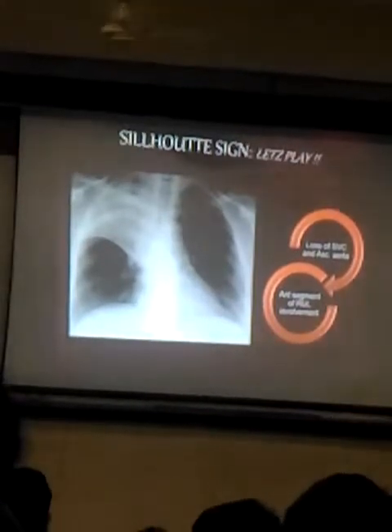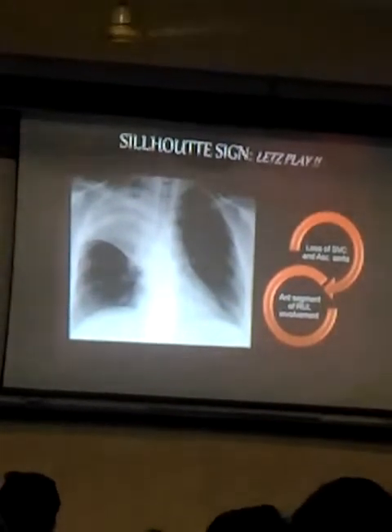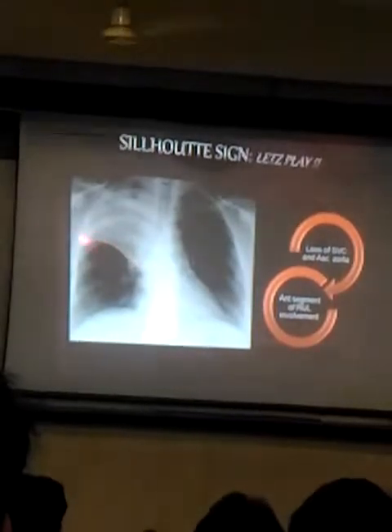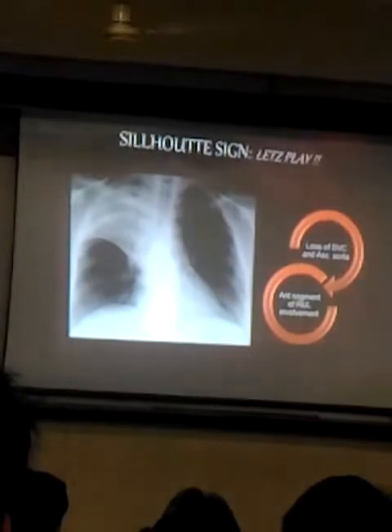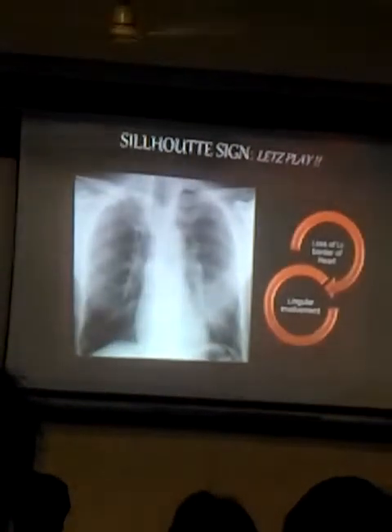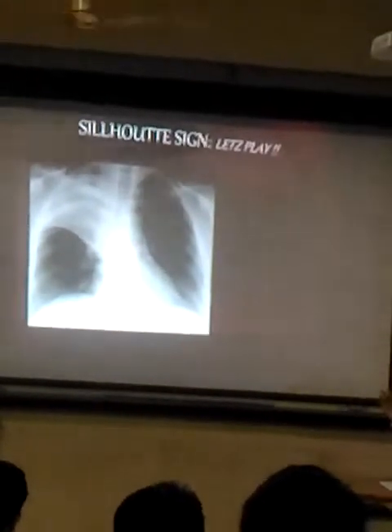I want you to identify two important findings on this one image. What are those two important findings? Number one, can you appreciate that this opacity is limited inferiorly by a very, very sharp margin here? See how sharp the lower margin is. Lung consolidations are a diffuse process which never have a sharp margin. Never. Just look at this opacity, relatively ill-defined. As compared to these consolidations here, look how sharp the inferior margin is here.